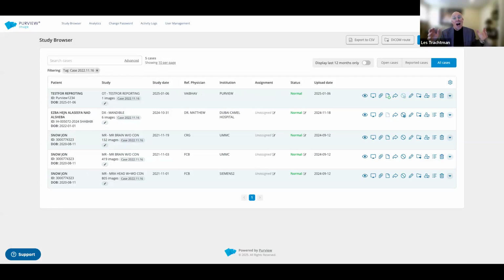It's a not yet released function, so it's going to come off of some different slides than you have here. But what our client said to us is that it's great that you can tag these things, but that's also a pain in the neck, since they all started with the same case, and I uploaded them to your system, and now they're showing up in a client or patient orientation, and then you have to re-tag them. So some smart person said, what if you could tag them on the way up? So as you're uploading them, go for it, Ari. Show them what we're going to do. That's right.